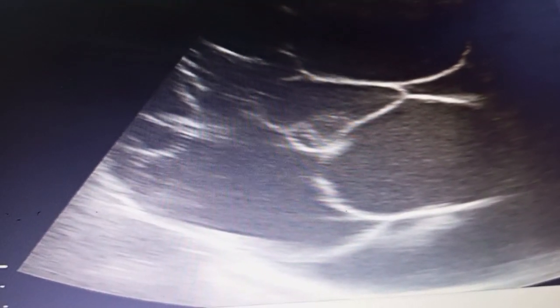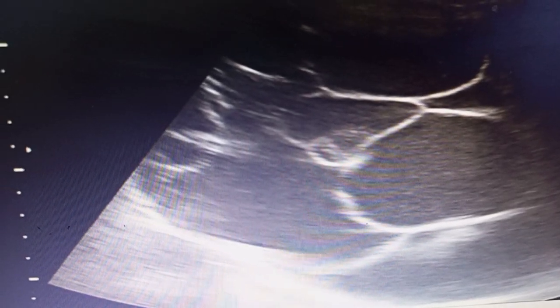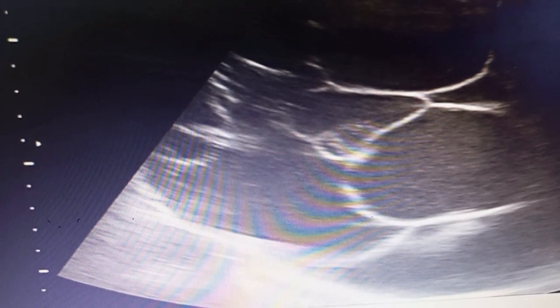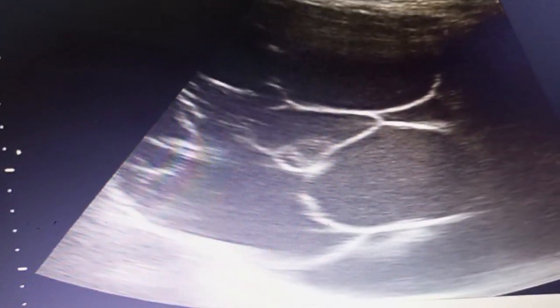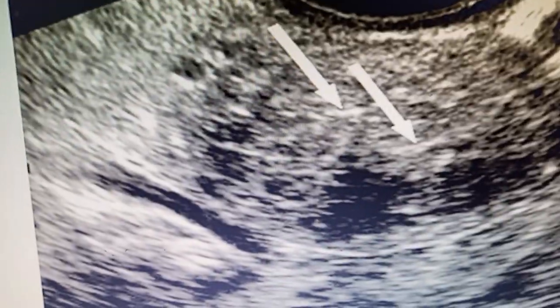This is the case of the mucinous cystadenoma. These are mucin containing epithelial ovarian tumors. They are large in size, and they are multilocular, with low level internal echoes. This is the typical mucinous cystadenoma of the ovary. This is a case of metastasis to the ovary.